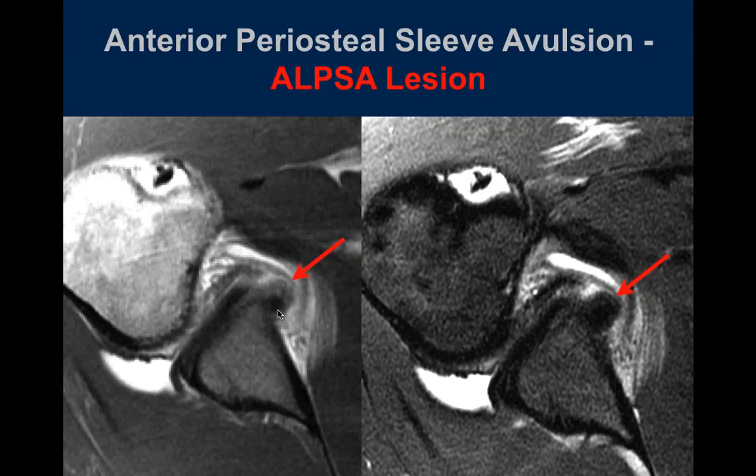John, this is an old injury with the labrum tacked down to the glenoid and healed in that position, with probably multiple recurrent dislocations. Correct.